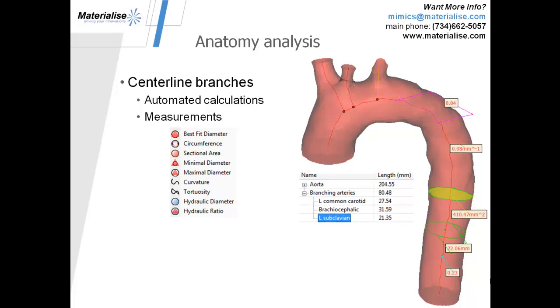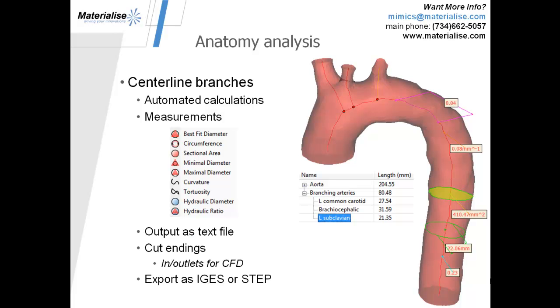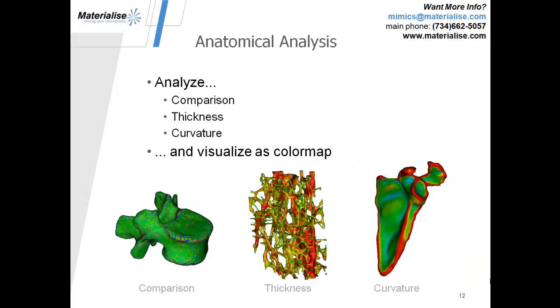cross-sectional area, and all of these measurements can help you define the use conditions for your medical device, whether it be to improve old devices or maybe create a database or a library for defining new devices and what the patient population looks like. It's all possible.